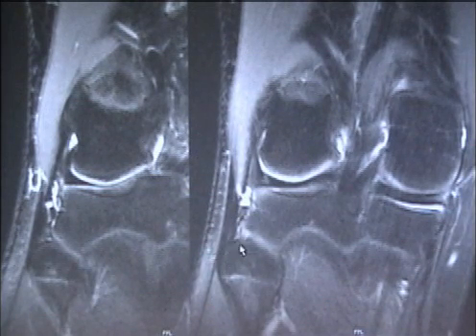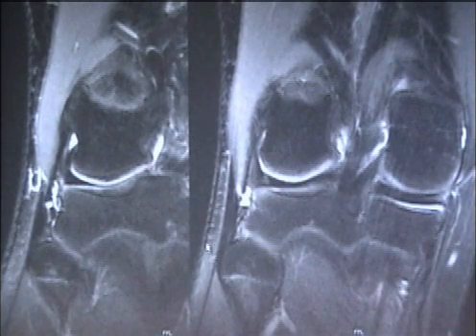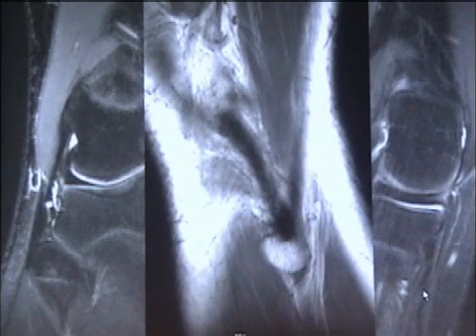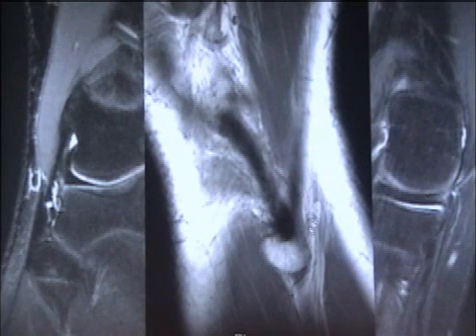The important thing to notice in this picture, and I'm going to emphasize this over and over because this is how you're going to determine which ligaments are injured, is that these ligaments insert relatively laterally. Okay, laterally on the fibular head. This is what they look like on your sagittal images, the Playboy bunny ears. Here, the fibular collateral ligament. This is the tendon of the biceps femoris. These come together. They form the bunny ears here, conjoined tendon here, inserting on the lateral aspect of the fibular head.